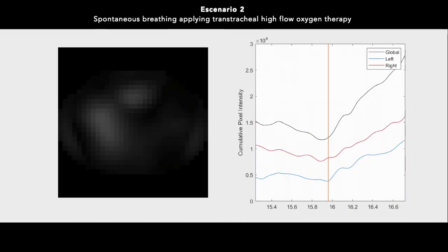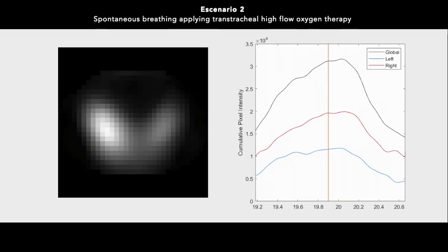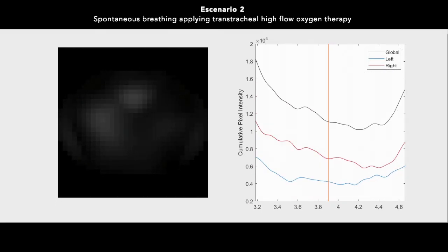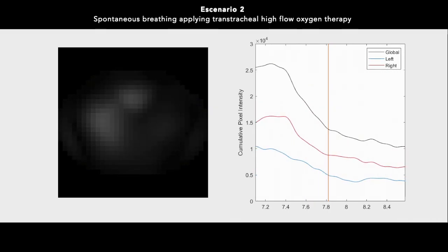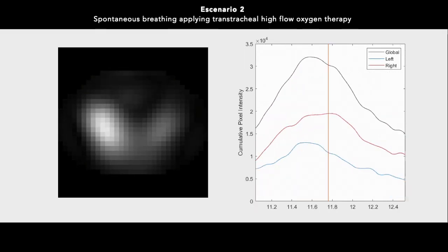In the graph on the right, the red line, representing changes in impedance in the native lung, is higher and has higher time constants compared to the previous scenario. These changes highlight the increase in tidal ventilation in the native lung, with an increase in expiratory time constants due to tidal hyperinflation.